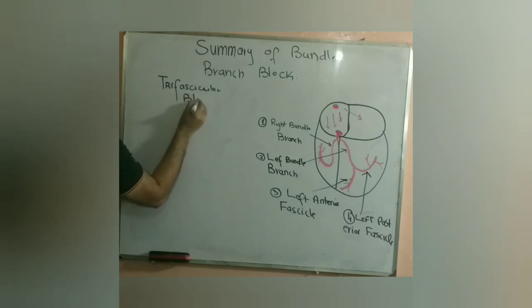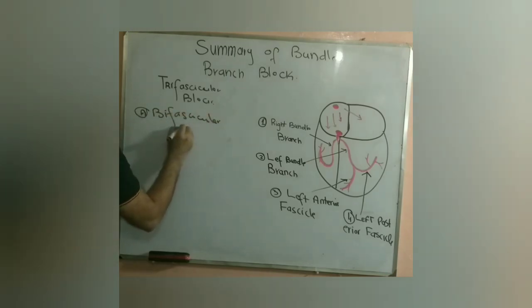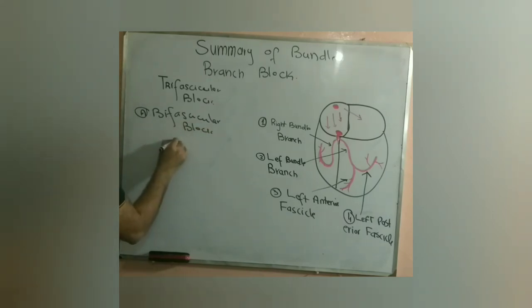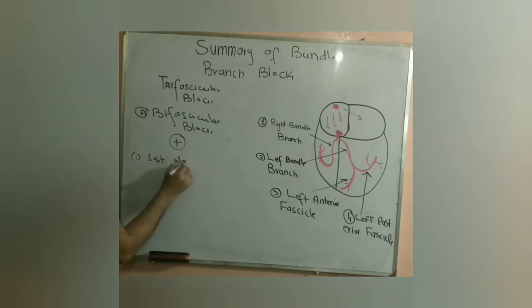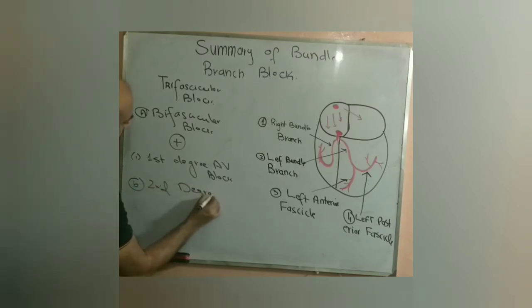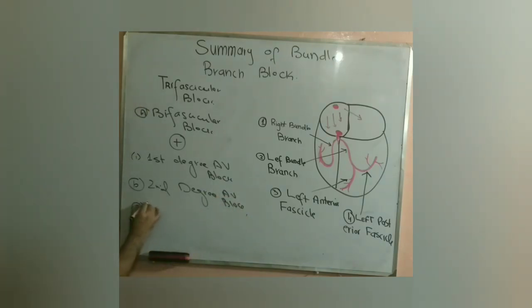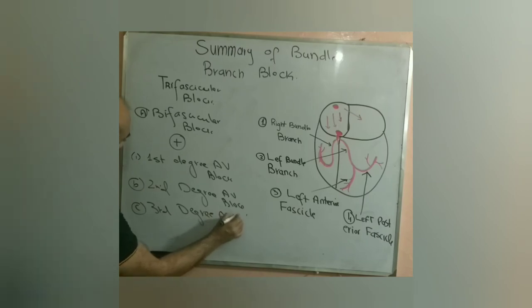Trifascicular block is actually a bifascicular block plus either first degree AV block, or second degree AV block, or third degree AV block.